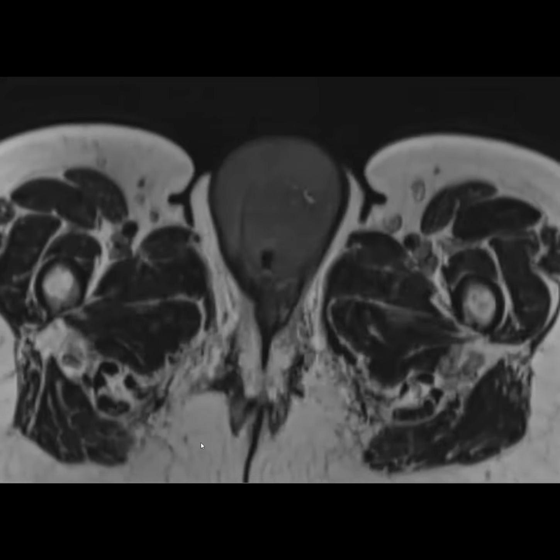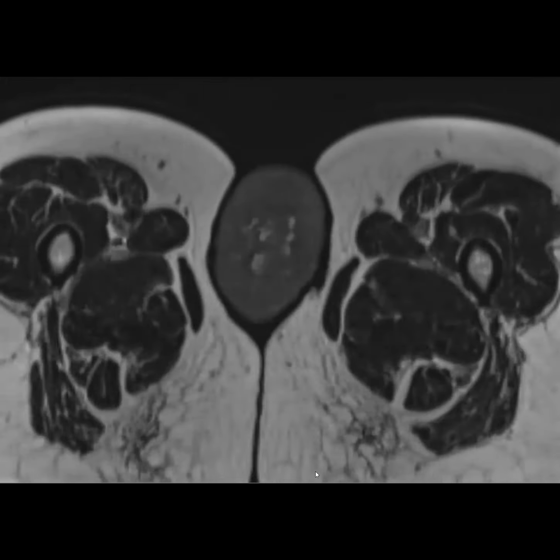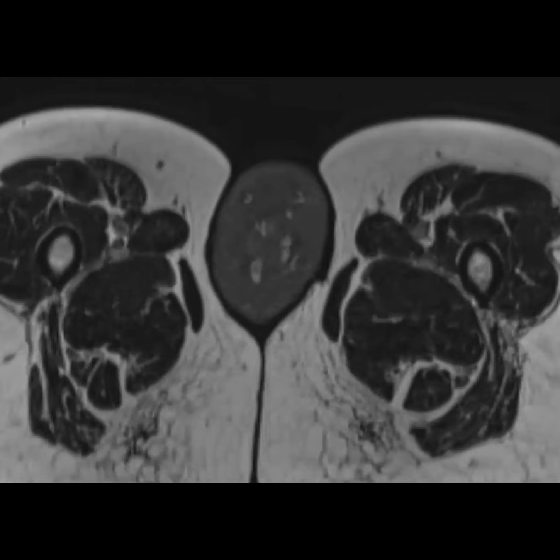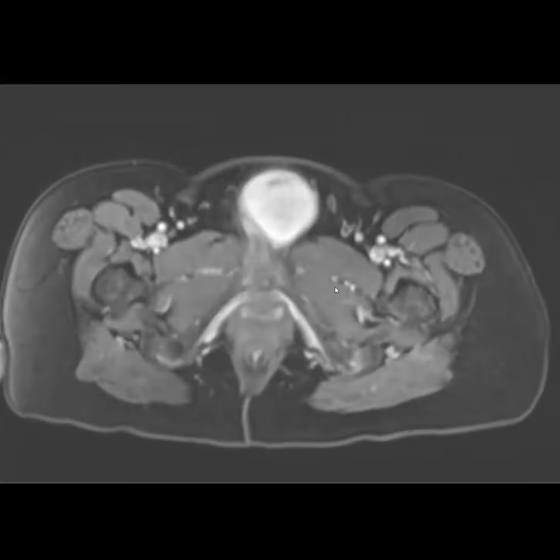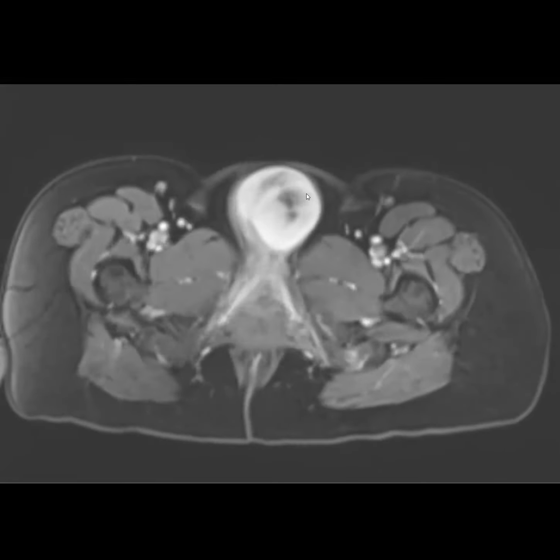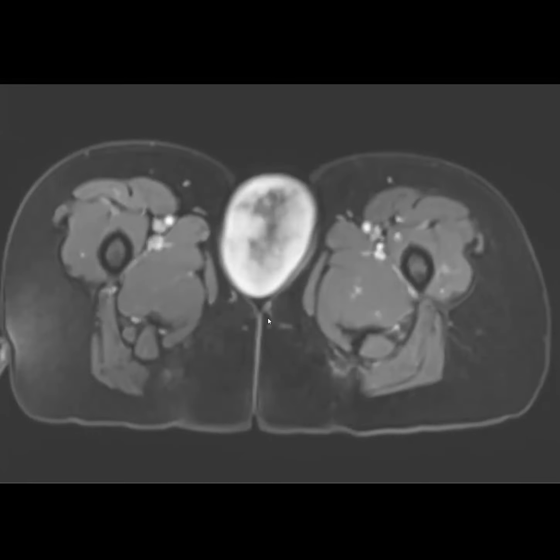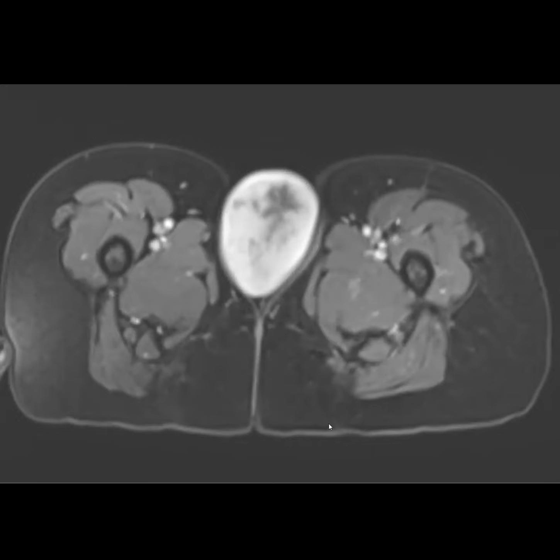So we've got a large, pretty homogeneous appearing clitoral mass, which is a rare thing. And this was the enhancement. So it was avidly enhancing. I just wanted to show this as a show and tell. We wouldn't necessarily get the diagnosis, but it's something that needs to be removed. Any guesses on what this could be? It was kind of intermediate on T2. Yeah. Restricted diffusion, avidly enhancing.